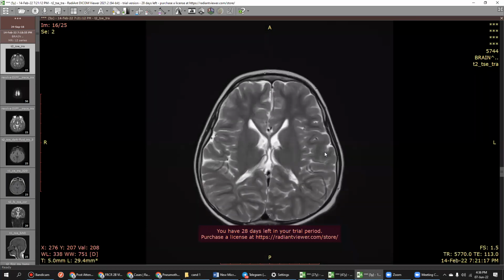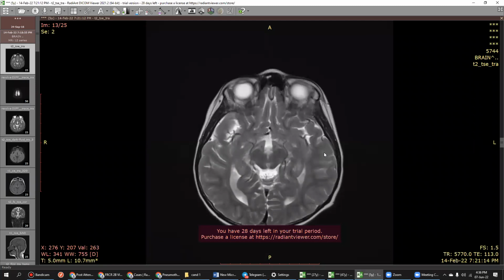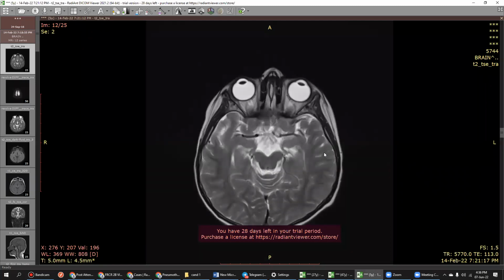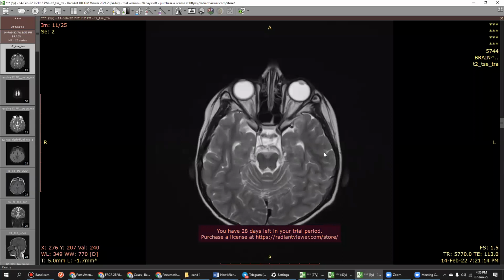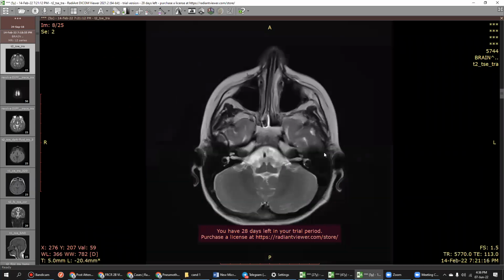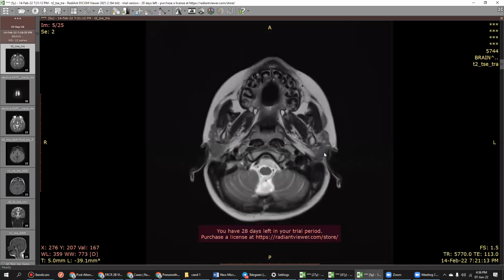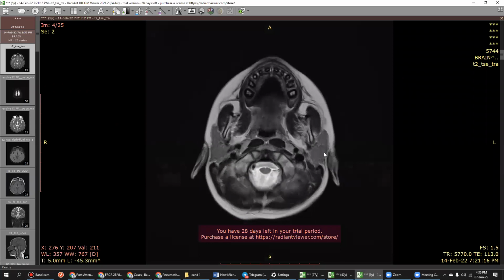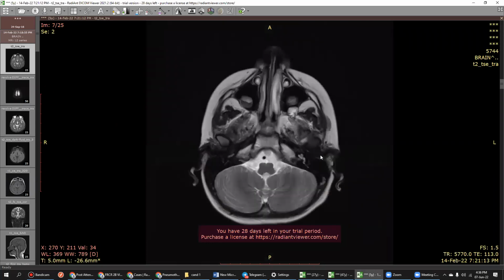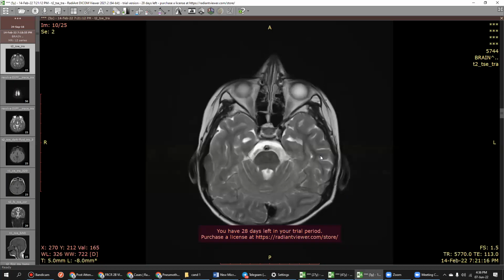I don't find any evidence of T2 hyperintensity. So I will start systematically, coming back.